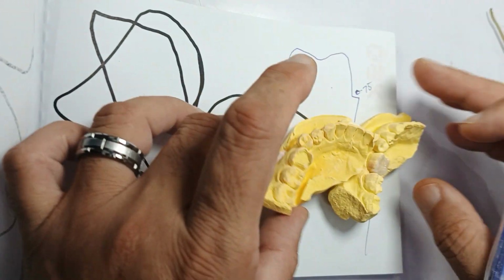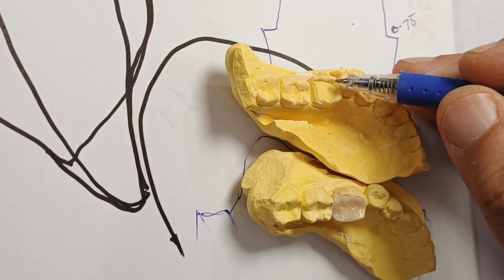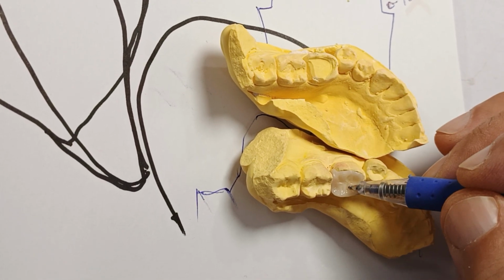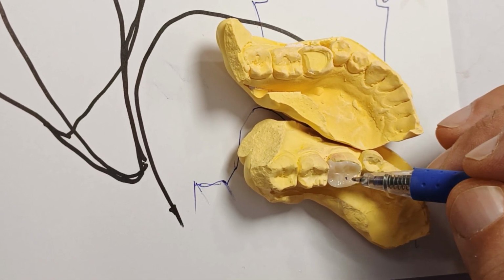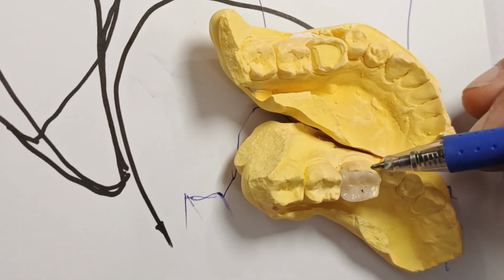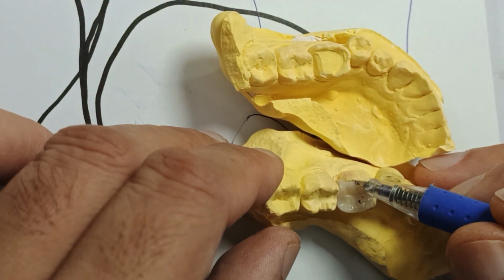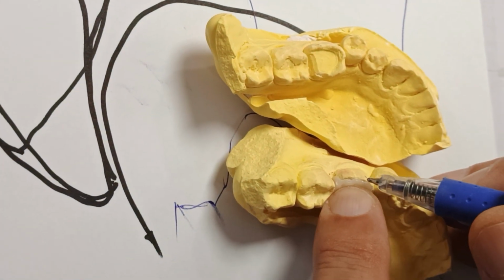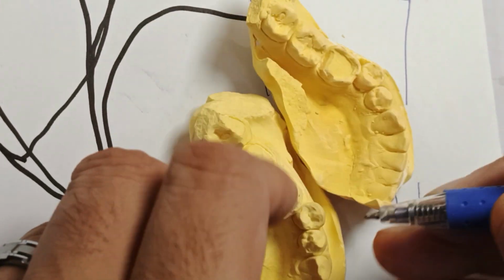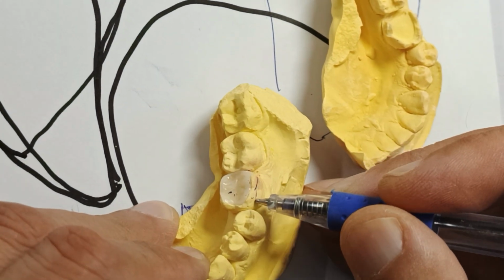This is an onlay they made, lingual cusp onlay. Where is the retention? What is going to hold it in beside just the cement? And the principle of an onlay is that you have to cover the functional cusp or an occlusion. The occlusion is going to be right here. This is lower arch. The buccal cusp is an occlusion. The onlay needed to be brought down to this level.